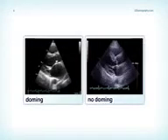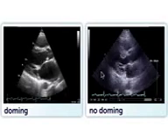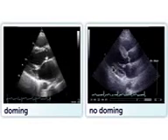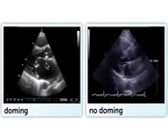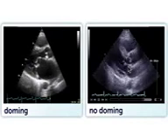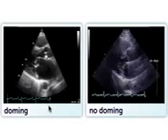This is an example. On the left-hand side, you see a patient with a classic doming and mitral stenosis, and on the right hand, you see a normal echo. Look at the motion of the anterior leaflet. Compare the two. Here you see the typical bulging motion of the anterior leaflet, while the leaflet opens completely normally here in this normal patient. Remember, you can best see the doming motion in a parasternal long axis view.